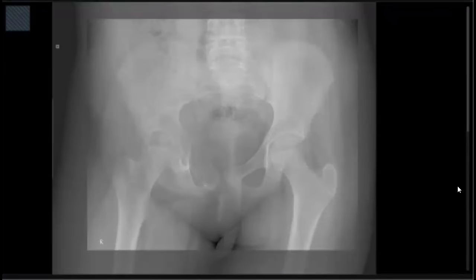What's your diagnosis? The diagnosis in a motor vehicle accident... Normally I would consider a motor vehicle accident, as in the previous patient. So this can be an aneurysmal bone cyst at this age, or it could be a primary bone tumor. However, did you describe any bone lesion? You are just thinking, but you didn't describe anything.